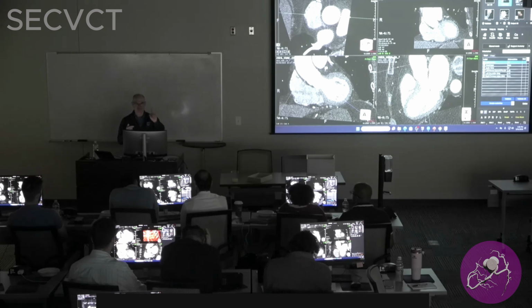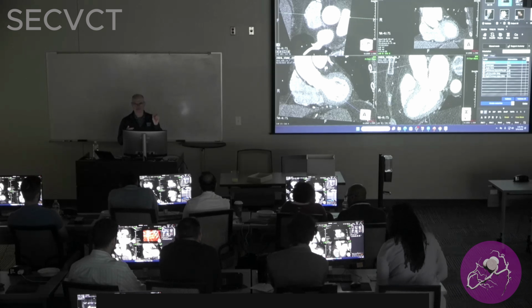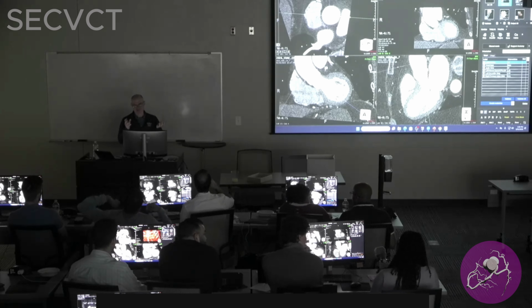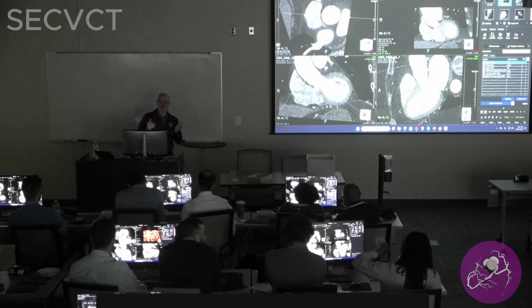And you may have mentioned the annulus. There are two measurements. We have a diameter by area and a diameter by perimeter. Why is that? We have the diameter for area for the balloon expandable devices that were FDA approved based on the area of the annulus. The perimeter was for the self-expanding, which were done based on the circumference. And so I use those two devices.